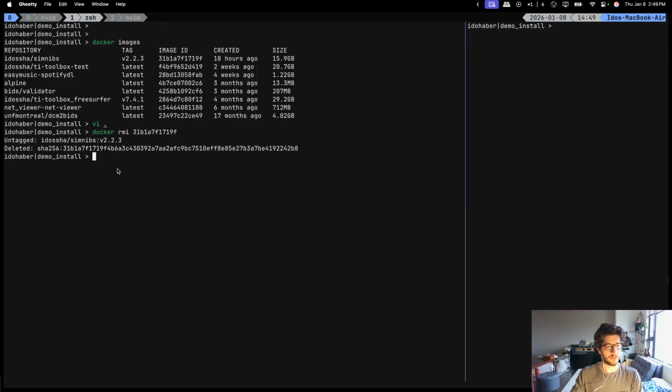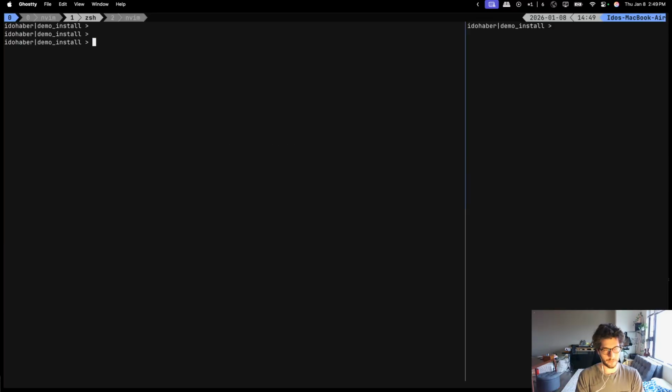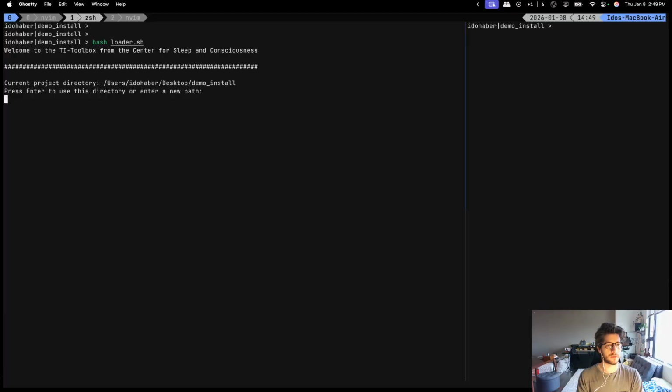RMI to remove an image, and if I then list my images again, it will be gone. And that's okay. If you don't have a desired version on your system and you're trying to call it, it will recognize that, check if it's available online, and if so, pull it to your local machine.